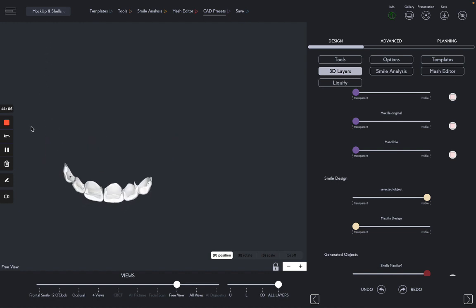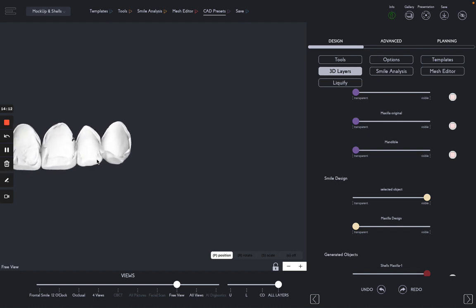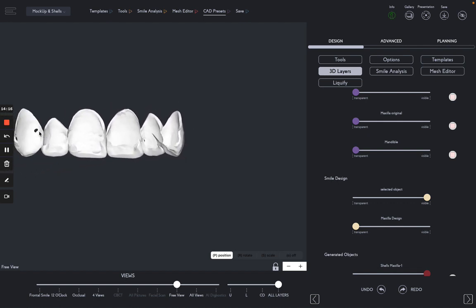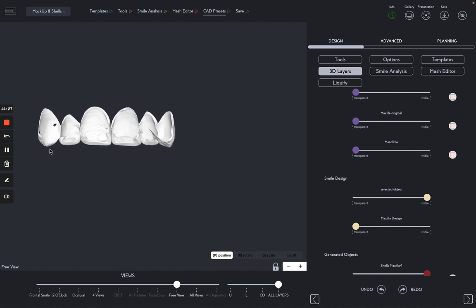Of course, here is a demonstration. Make sure that you have a proper thickness. Actually, this is good that I have a little hole in here. As you could see, I wasn't paying attention to this. I was just demonstrating those 2 centrals, and the centrals are fine. But this one is very thin, and there is a little hole in there. That's why it's important for you to check on the proper thickness. Make sure that you have enough thickness on your 3D design, and you can check that with the cross section for you to prevent having these little holes in here.